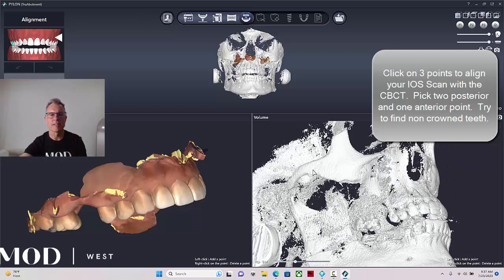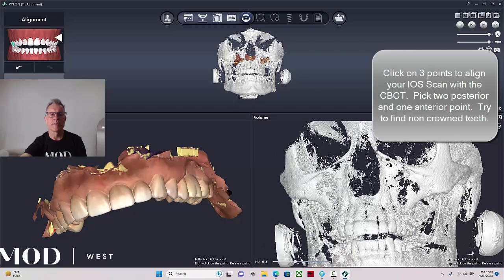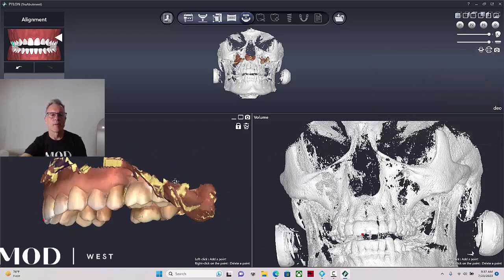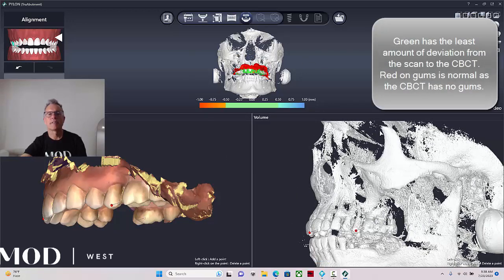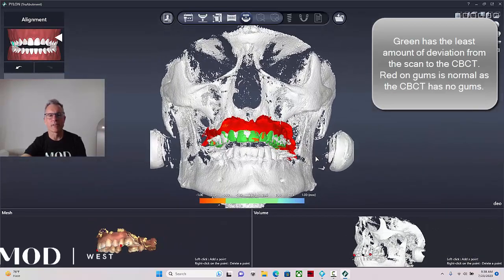So I'm going to select the mesiobuccal of 3. And I'm going to select the mesioincisal of 8. And I'm going to select a premolar here. And you can see up on top, something got matched up. So I'm going to scroll this down and take a look.